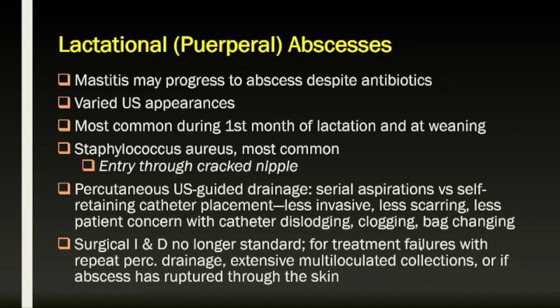So it's important to look deep and make certain that you don't have a retromammary abscess that is actually proceeding through the muscle. Mastitis can progress, as I've shown you, to abscess despite antibiotics, so these patients need to be followed up. They have varied ultrasound appearances. Most common is to find them during the first month of lactation and at weaning. The entry of the pathogen, which is most often Staph aureus, is through a cracked nipple.